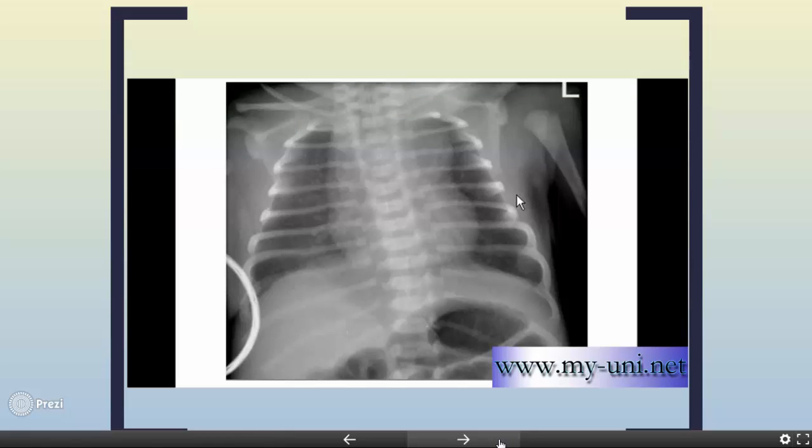Notice the normal bone density. There is a degree of radiation absorption within the bones as always, but some of the radiation is able to pass through, creating a unique appearance that makes you differentiate between bones and surroundings.